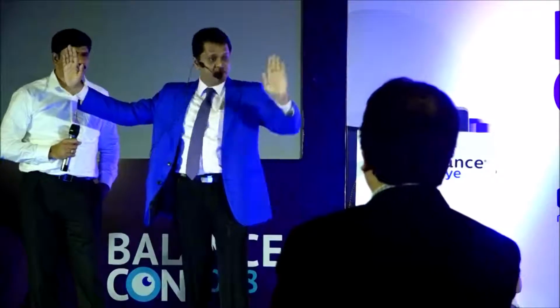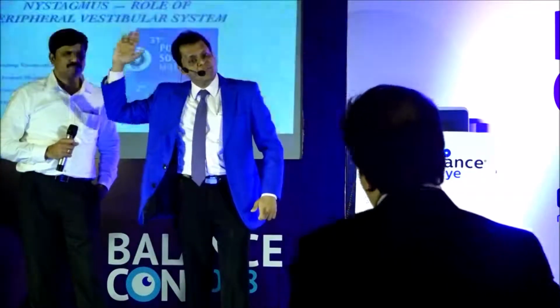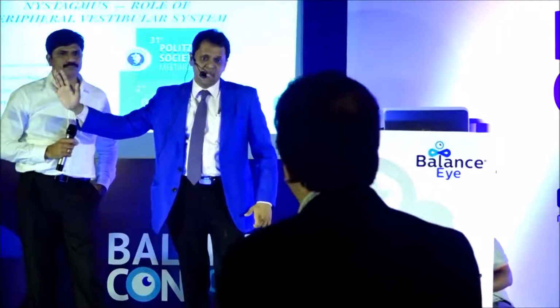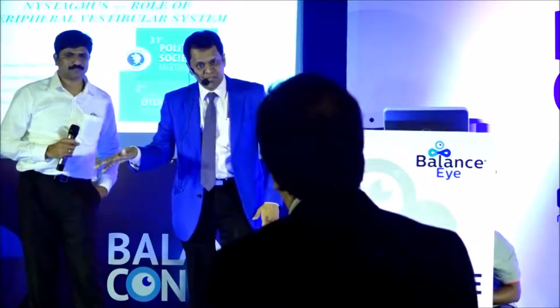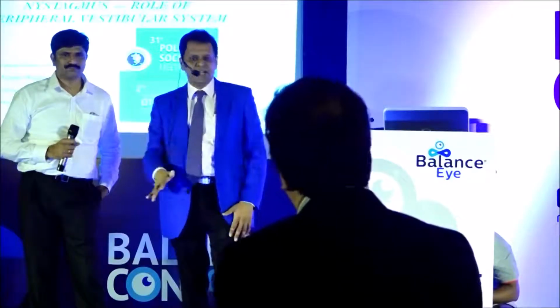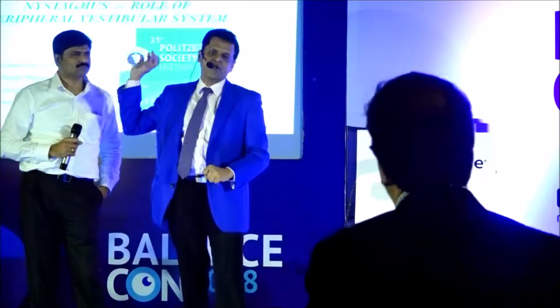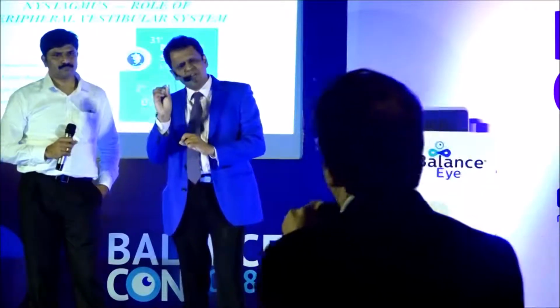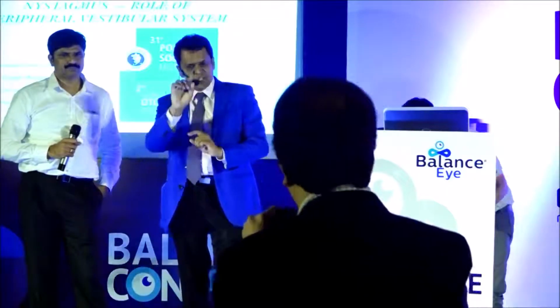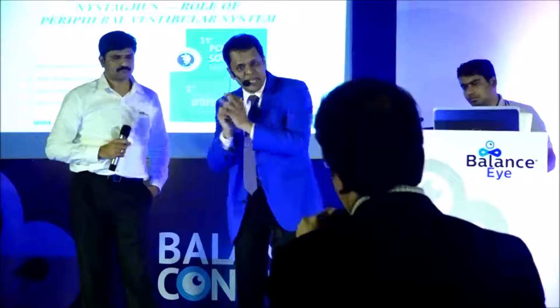1.5T with GAD, 3T without GAD, I'll do 1.5T with GAD. I will do GAD, unless and until, obviously, there's a frank contraindication. I will do with GAD. Full stop. Otherwise, Dr. Dutt, there is no way you can actually diagnose the intralabyrinthine and the smaller intracanalicular lesions, especially if they're towards the fundus, because the fundus is a crowded area.